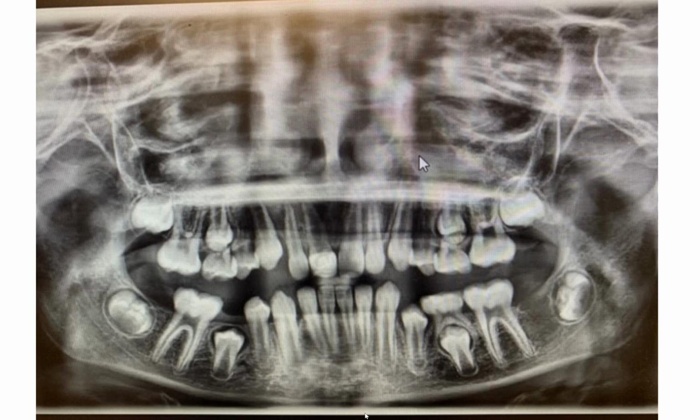So take a moment to look for where the odontogenic keratocyst is located, and if you look closely in the areas of the root apices as well as the interdental distances, you should be able to find where that is. So take a moment to evaluate both upper as well as lower teeth, and hopefully by now most of you have identified where this lesion is.